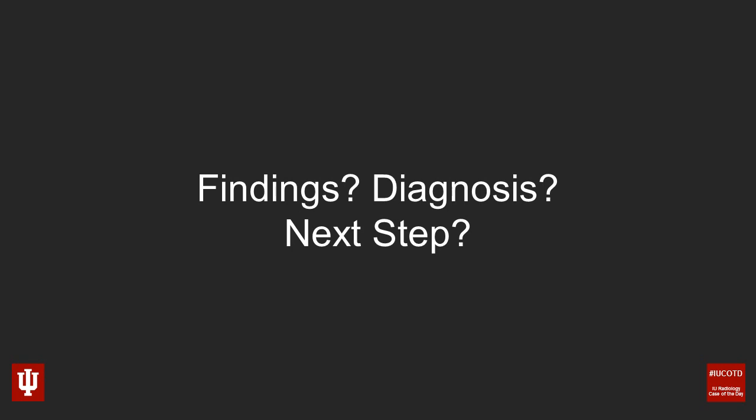Okay, so I've got 3 questions for you this time. First of all, what are the findings? Second, what's the most likely diagnosis here? And the third question is, what's the next appropriate step in the workup of this patient? Something that you as a radiologist can do.